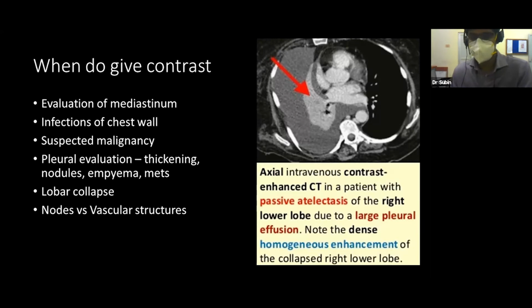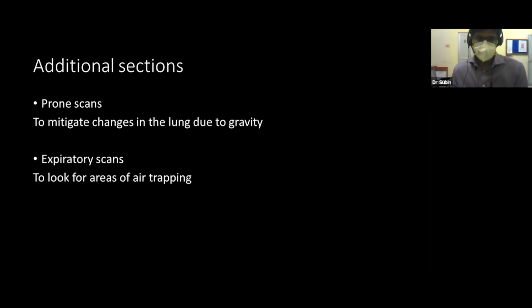So whenever you have nodes, when you need to look for thoracic adenopathy in case of lymphoma or any of those things where nodes are required to be evaluated, you have to give contrast.